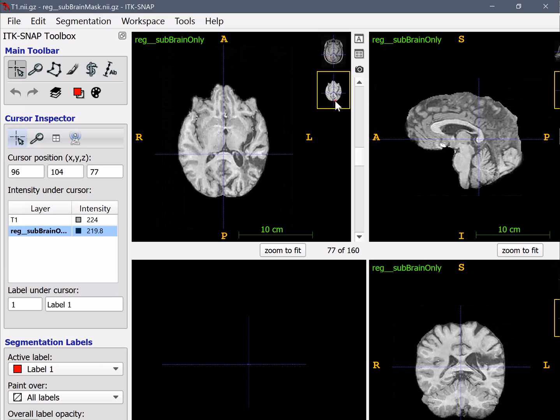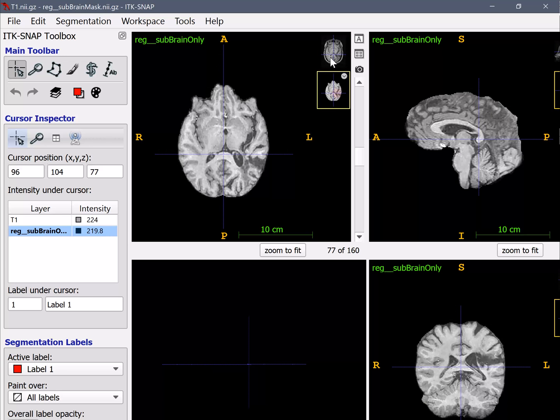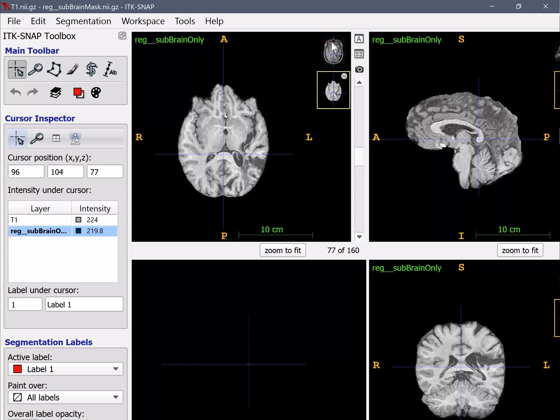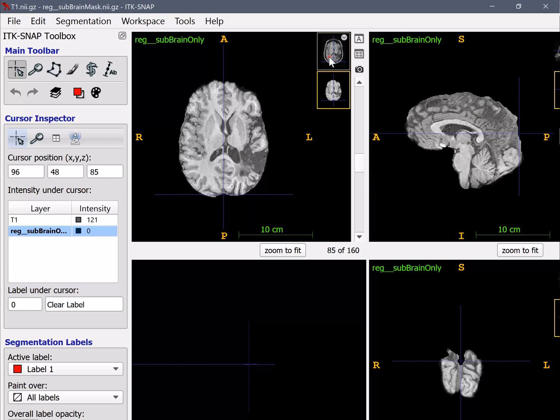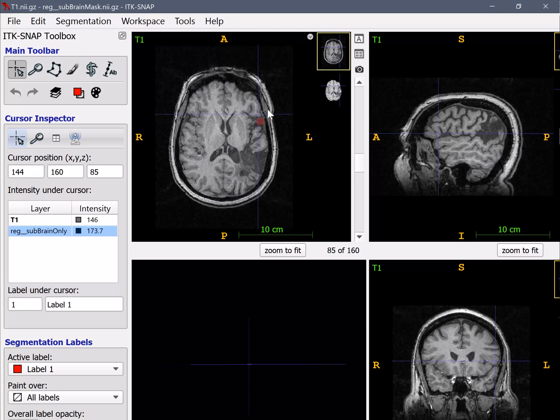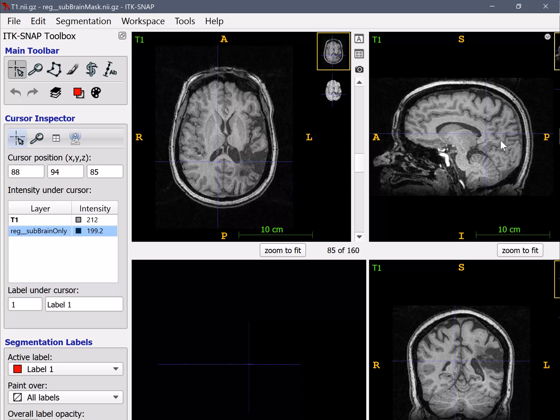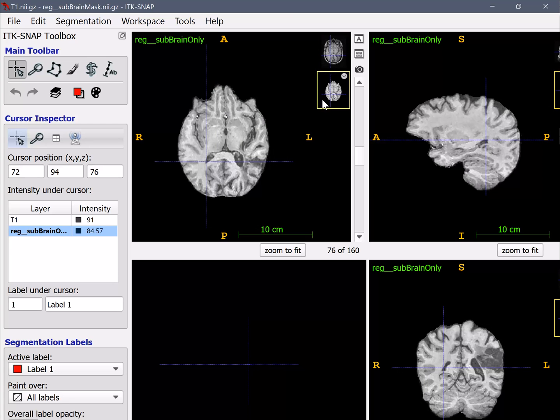Okay, obviously these are in template space, in the same space, because it's the same image. And the only difference that you should see is that one has the skull, the other doesn't. You can try to make sure that wherever the skull is removed, the brain is not removed. And the other thing that I want to show you is this denoising that actually is applied in LESYMAP.